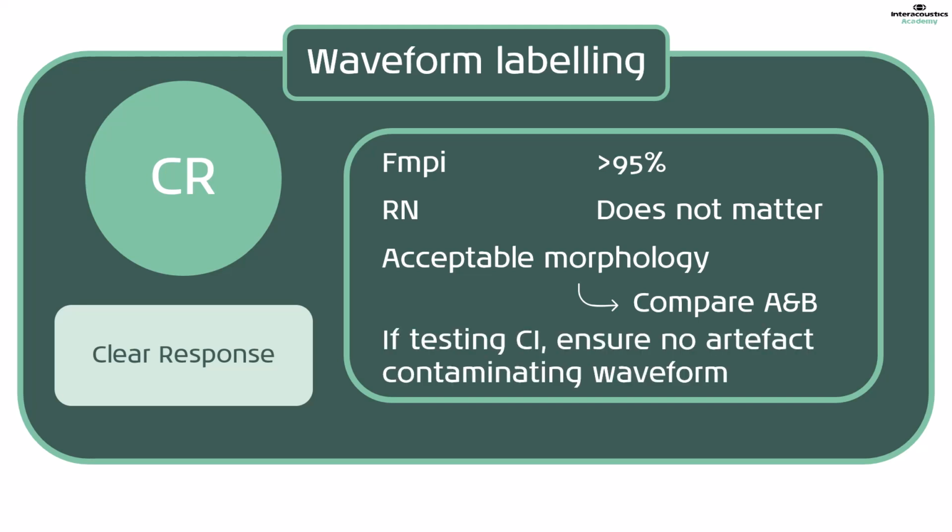If testing a patient with a cochlear implant, it is important to ensure there is no artifact present in the waveform, as this can be misidentified by the FMPI detection algorithm as a response.